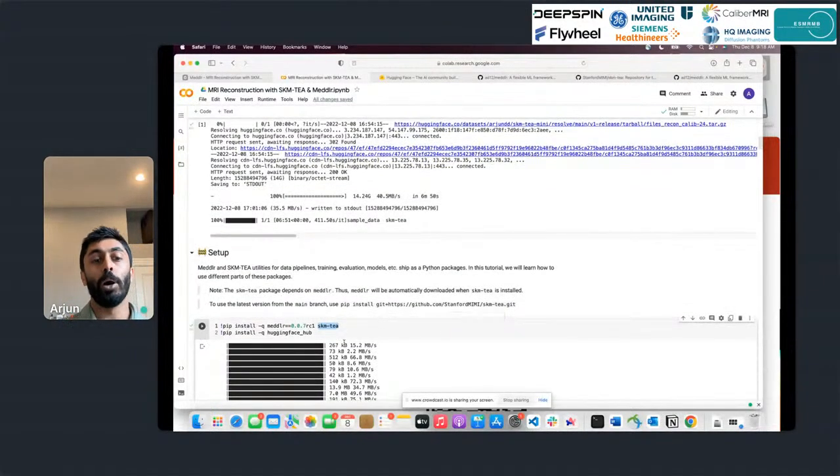And one thing that we'll jump into later, which I mentioned a little bit earlier, is the Hugging Face library or framework. Hugging Face is a company that has simplified the sharing hub platform for a lot of deep learning models, and they implement their own models and have done a great job of open sourcing very exciting models and different applications of deep learning. We'll go ahead and install their package as well, because later in this talk we'll show how we can take meddlr and directly upload our models on Hugging Face for user use.